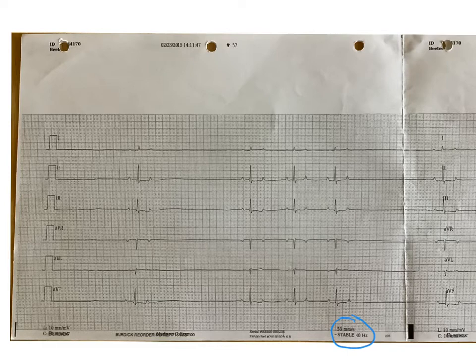What we are looking at on our ECG paper is a large square, and inside of this large square there are 5 small squares. To figure out how far 50 millimeters is, we just need to count 50 small squares. Then we count the number of heartbeats that happen in that time period. To count the heartbeats, we count each individual R wave as one heartbeat.